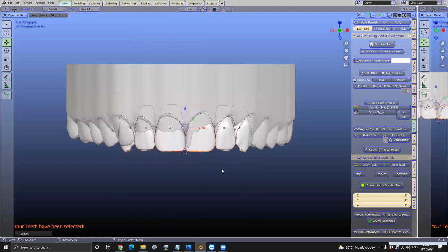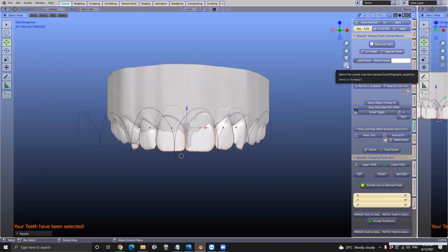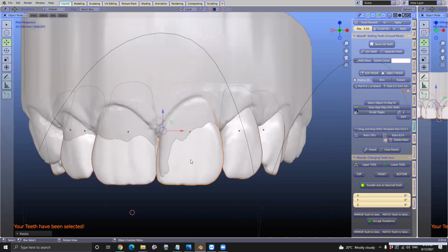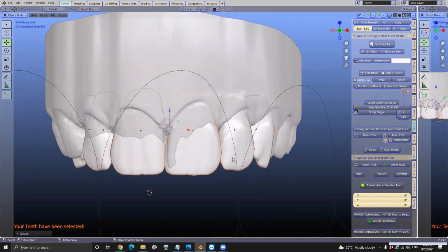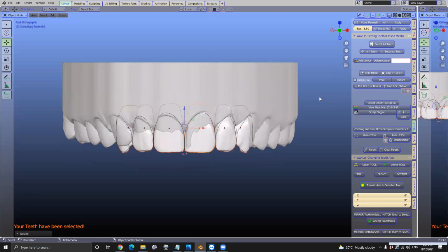Now there's a few things we want to still do, is we want to get an orthodontic arch in this picture. There was a question about perspective view. Can you work in perspective view? No, because this perspective view, I never use it in Blender. I find it really confusing. And as you can see, the front teeth are very large, and then it just goes towards the outside. So there's no good reference. So generally speaking, we never use it.